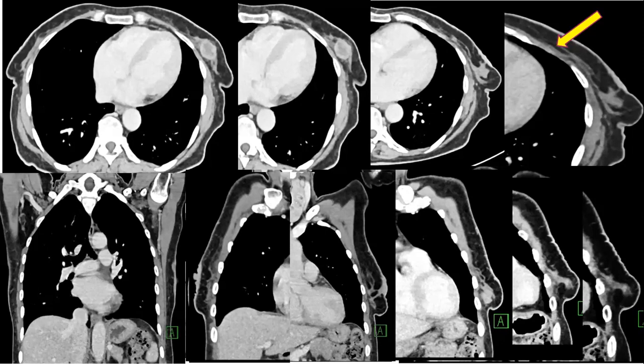That is why it is infiltrating into the apex of the pectoralis as well as the chest wall. If you have seen here, there is even some tethering, an area of enhancement at the apex more than the rest, and just focal thickening. These are the features that signify the involvement of underlying structures. Okay.